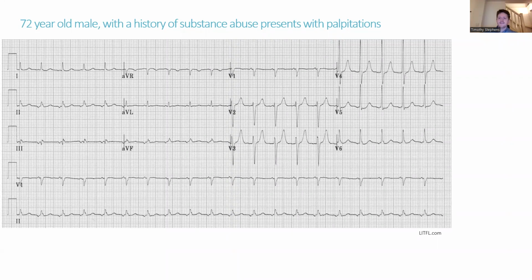Okay, we've got a yes. Let's see if we have somebody else who wants to confirm that as well. Anybody else think yes? Okay, no worries. You couldn't be blamed for thinking that, to be honest, because you can see what looks quite clearly to be a P wave, can't you?